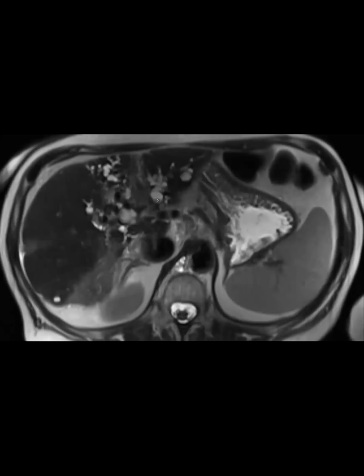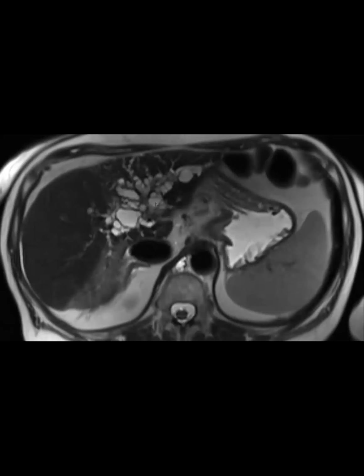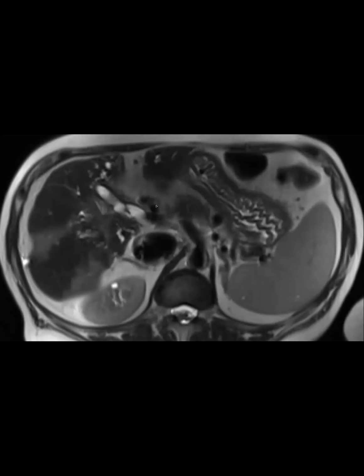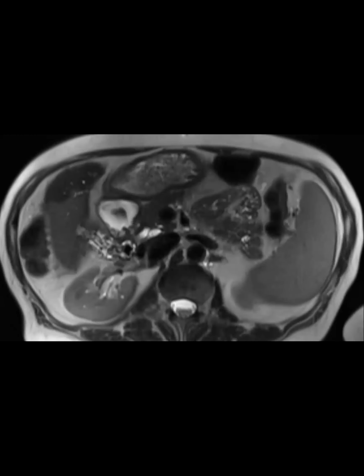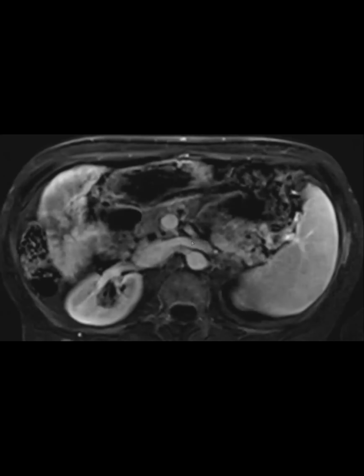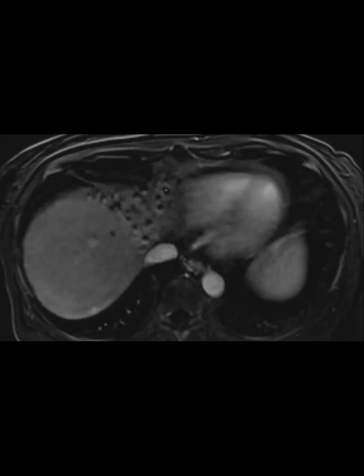Correct. And then this is what I was talking about. There are some T2 hypointensities. They could be just debris because we don't see any enhancing polypoid tissue there. But I thought it was a nice companion case to what Nelly just showed.